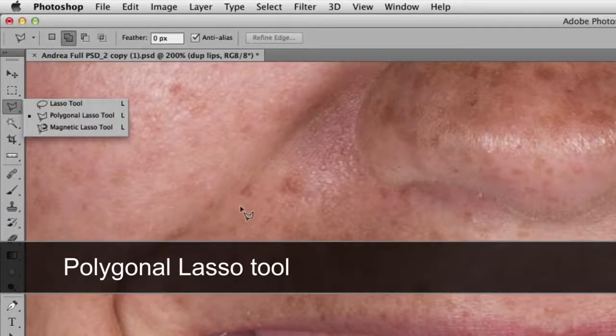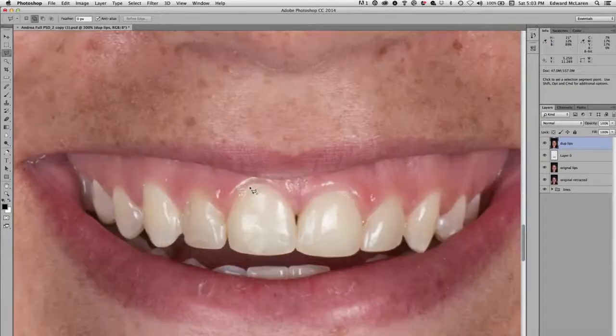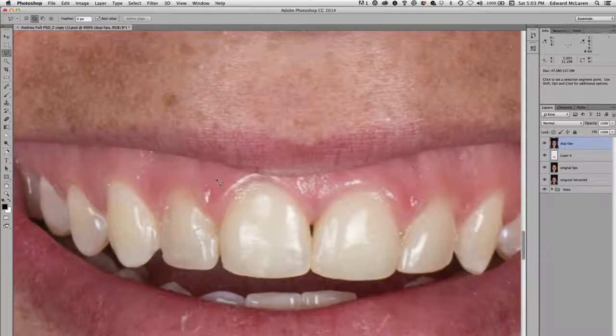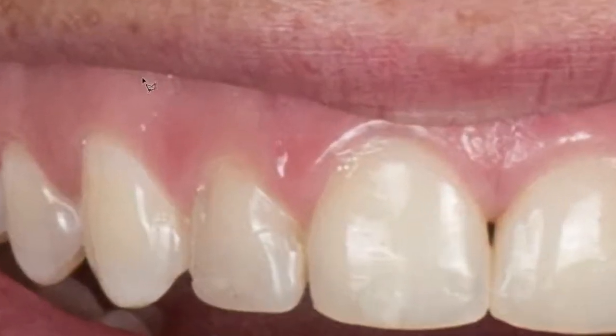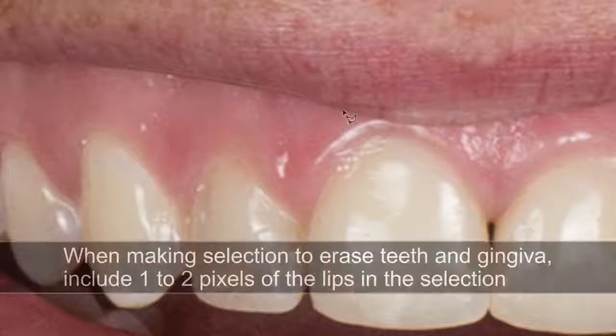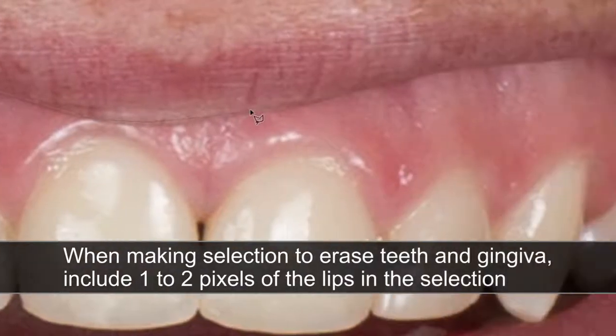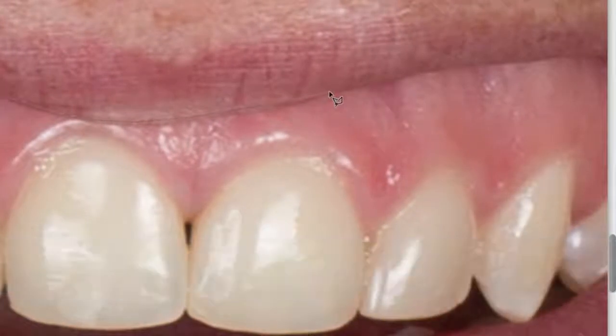The easiest way to do it is to use a selection tool. So I'm going to select the polygon lasso tool up here in the upper left-hand corner. Got that. And I'm going to zoom in just a little bit more, so Command or Control plus, and we're going to start and select. Now, when I select for this technique, we want to start our selection just outside, or let's say include a pixel or two of the lips. So we want to make sure that we erase all the gingiva and teeth in this image, anything that's intraoral.